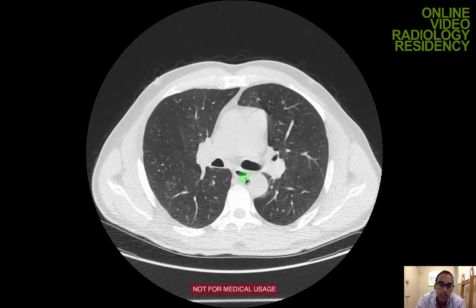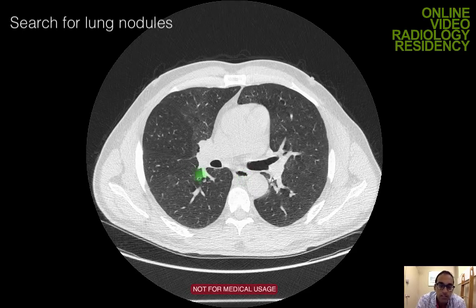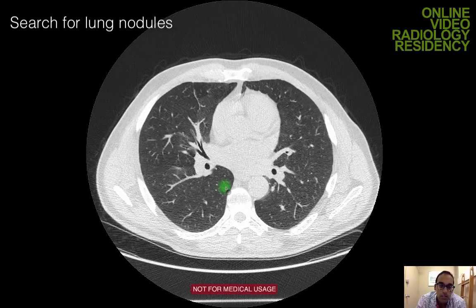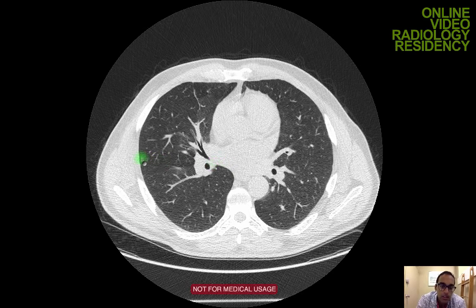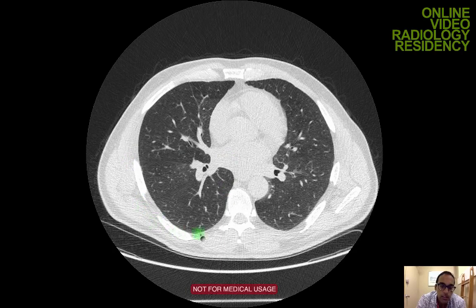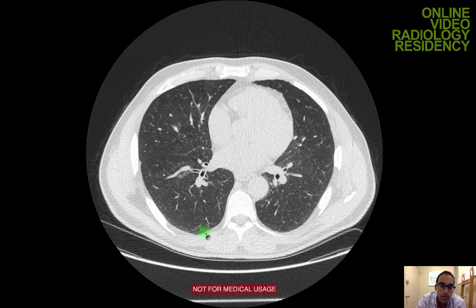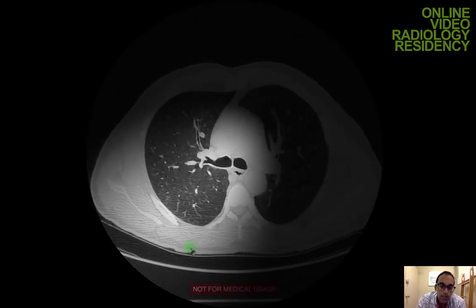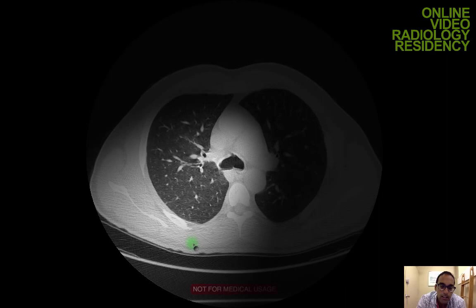So as I said, I'm looking at the lung parenchyma, looking for increased attenuation, decreased attenuation. I also want to screen for lung nodules on every thin section set of imaging, and these are thin sections at 1.25 millimeters. So I look for lung nodules. And how do I look for lung nodules? Basically, I split up the lung into one half here, and I just focus my eye on that one region, not particularly the lobe, just one region of the lung, and I'm scrolling up slowly and looking for a nodule of tissue to catch my eye in that region.